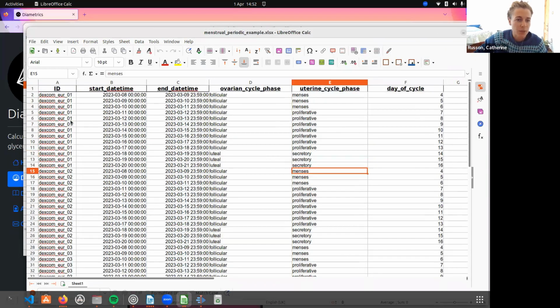So this is a European Dexcom in the format that it's in: person 1, person 2, person 3, the start date time, the end date time. The reason for doing this is that doing this in minutes, when you're looking at individual whole days, is maybe a bit too fiddly. So this is an easier way, in my opinion, to do longer periods of time.